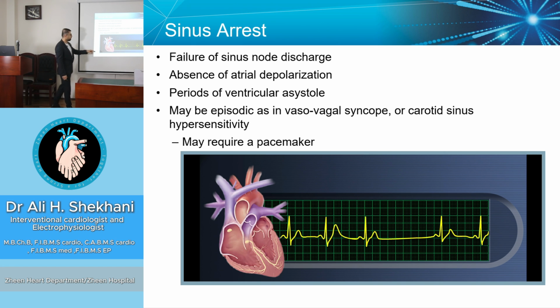You can see here this is a normal sinus beat, and suddenly it is prolonged. There is a pause here, and this pause is important. The longer the pause, the patient may become more symptomatic.